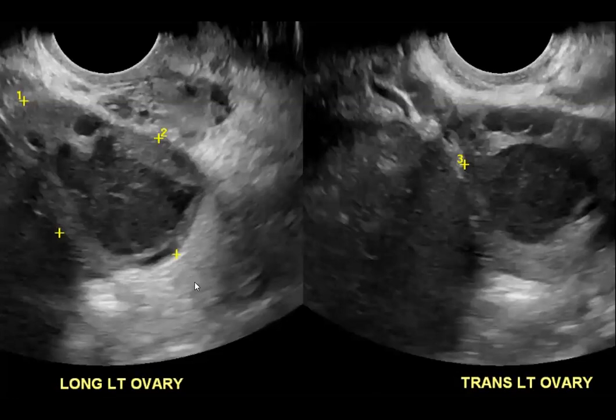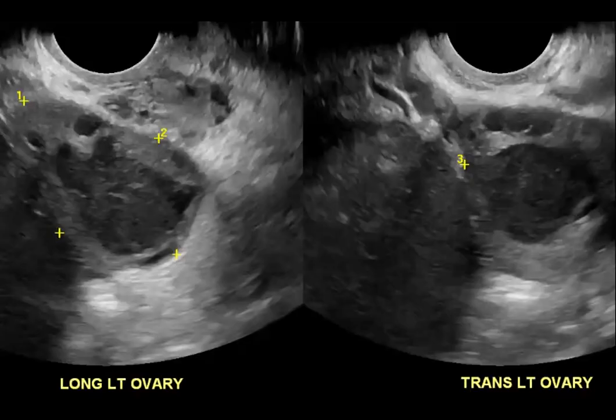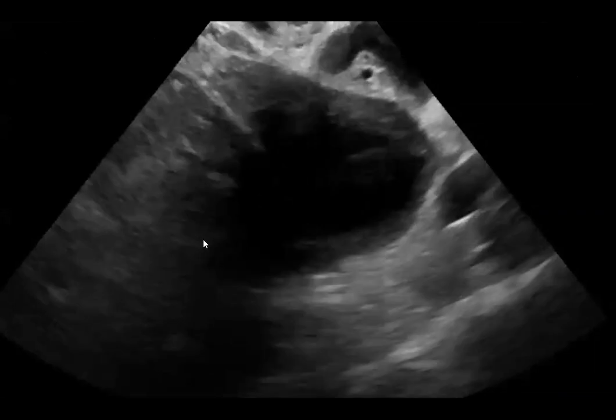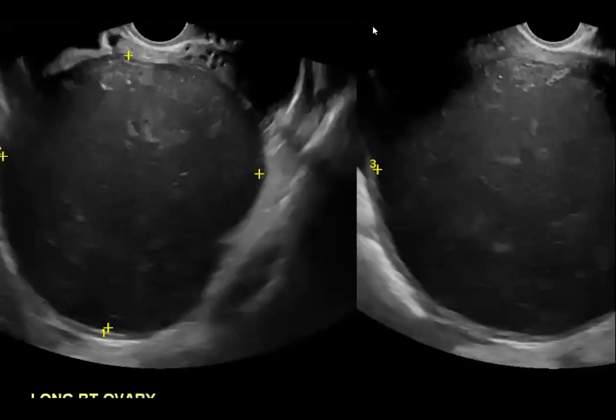Probably a pelvic MR. Okay, and what are you thinking this could be? I'm concerned that maybe it's a dermoid, or no, it just doesn't look happy. Okay, good. Especially this big lesion. You're thinking dermoid, but some of the features of dermoid we don't really see here.